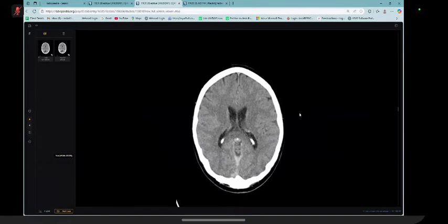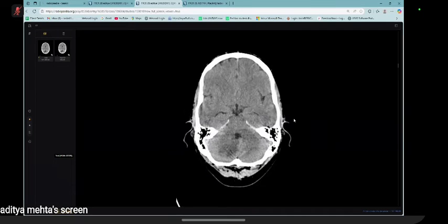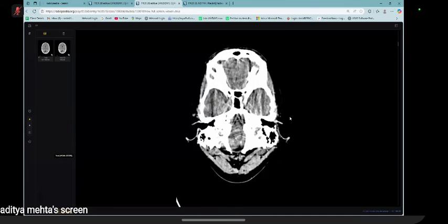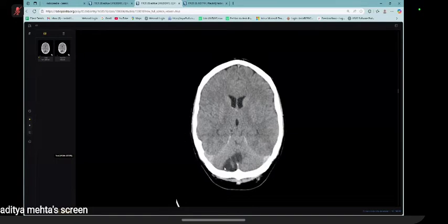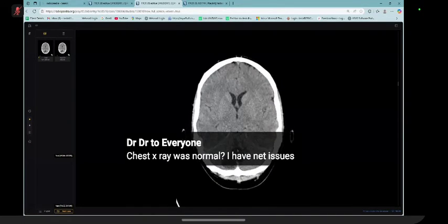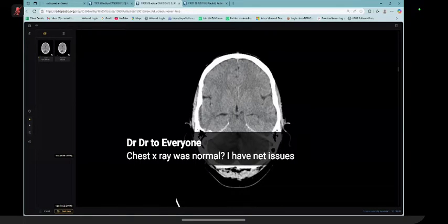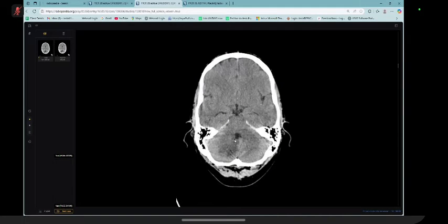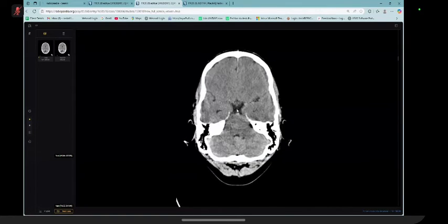Okay, this is a CT head, axial sections, brain window, 40-year-old patient having vertigo and headache. I can appreciate that there is a well-defined cystic lesion, well capsulated, in the posterior cranial fossa involving the right cerebellum. It is causing mass effect on the midline vermis, and also there is marked compression of the fourth ventricle with resultant mild hydrocephalus.